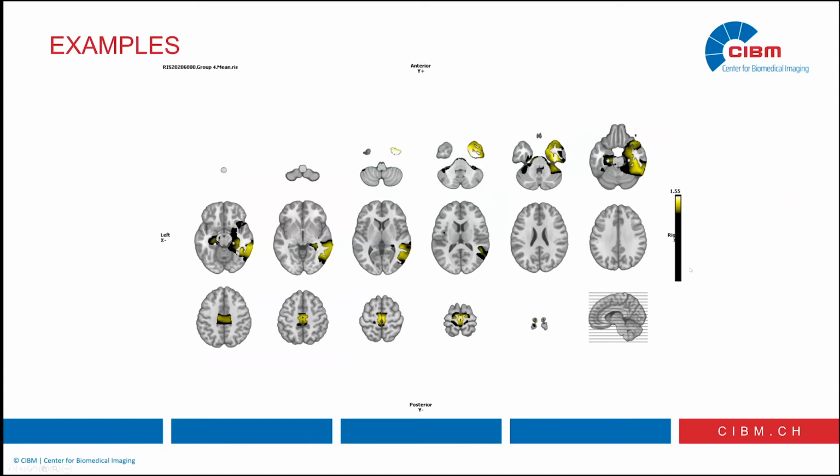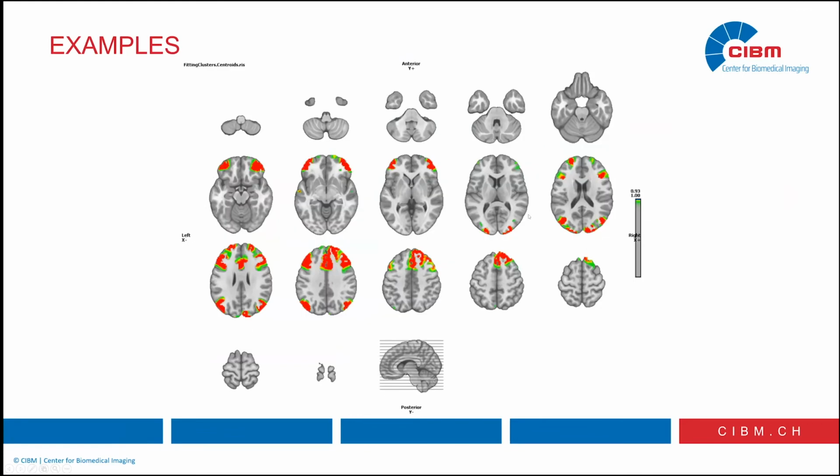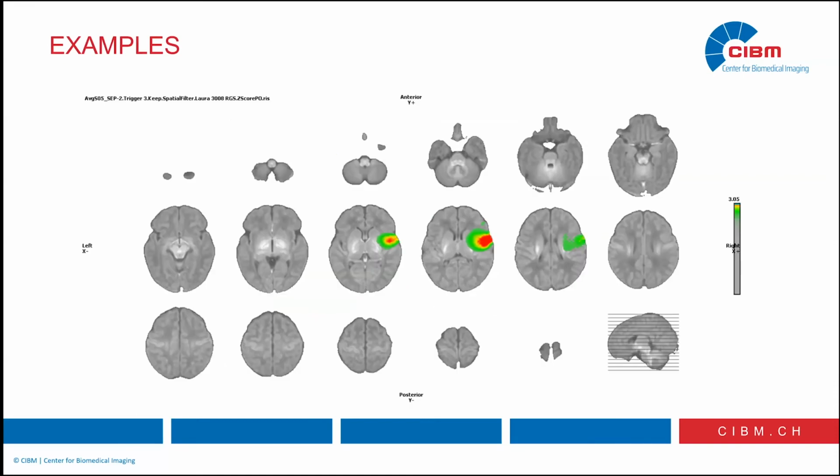So that's the easy part, for the template. We work every day with templates. Still templates, but resting state data, which are a bit more difficult. That's an example of the same template, the newborn template, with the mother talking to the baby.